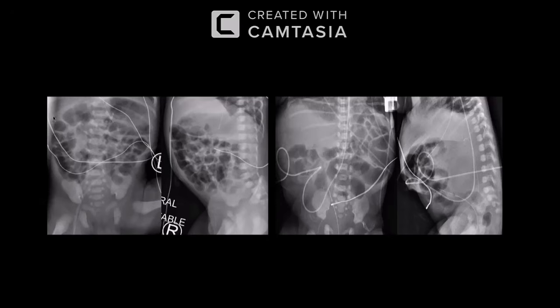So you are convinced there is some bowel pathology in this case. I'm looking at this case to assess the big clue in this. It is a little difficult, I can understand. I should have looked at the bones. No, not the bones. We did umbilical artery catheterization. So this is a check X-ray to see whether the catheters are in situ.